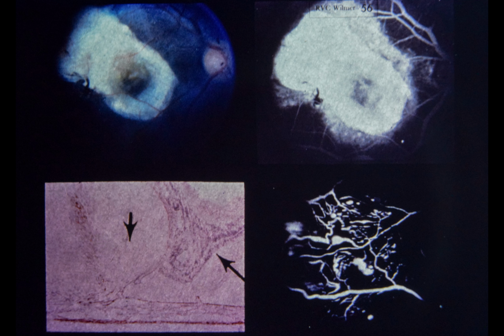Comment: no treatment can be expected to improve visual acuity in this patient. It is impossible to know from fluorescein angiography whether this patient also had vascular abnormalities at the posterior pole or whether the lipid deposition in the macula resulted from peripheral telangiectasis only. Many patients with macular lipid do not show vascular abnormalities in the macula.